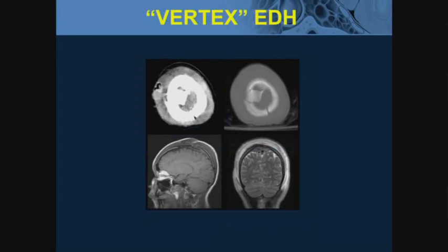It's amazing how little you can see sometimes on our axial scans. Here's a patient, big, huge subgaleal hematoma, depressed comminuted fracture here, here it is across the bone. We said this patient is in danger of having a venous epidural hematoma, and we ought to do a CTA or CTV, and the neurosurgery resident on call said, no, we don't need to do that, patient's doing just fine. But several hours later began to deteriorate, and for whatever reason, they ordered an MR scan, and this one clearly shows our classic venous epidural.